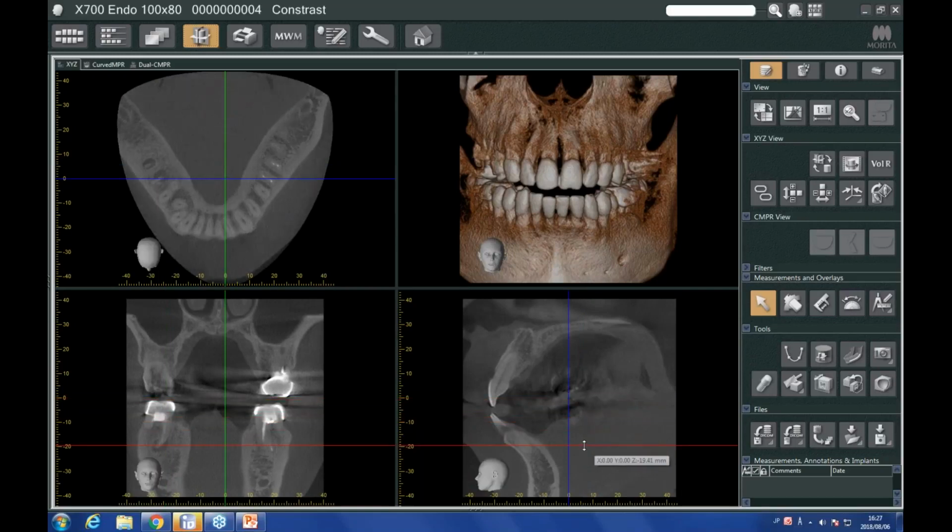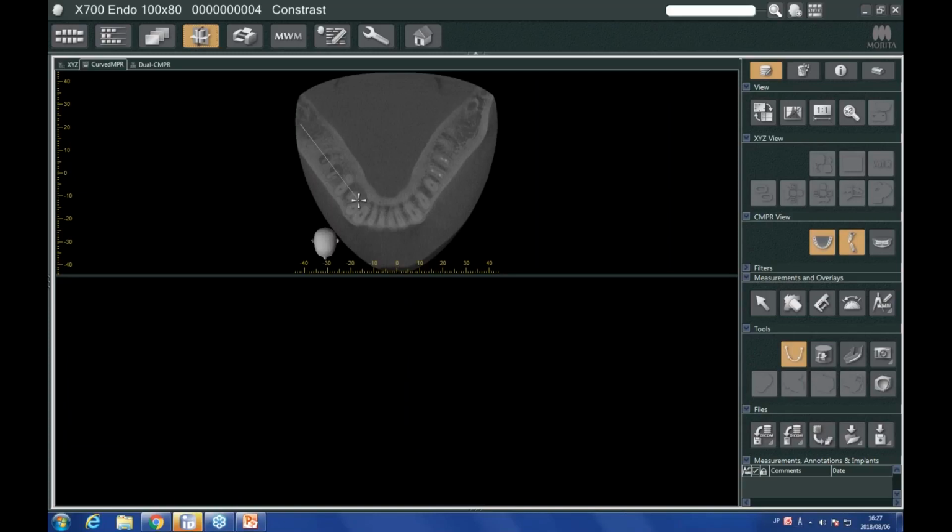So working on the mandible, if I'm going to do a presentation, say for example, for the patient or for the insurance companies, I can use the printing software within our i-Dixel imaging suite to give a radiological report on this particular volume. In many cases, we need that for insurance, or we need to do that to explain to the government why we took a particular volume. So this way we can set up templates within our printing software and then just generate that report at any time.